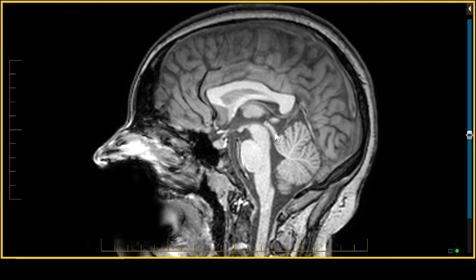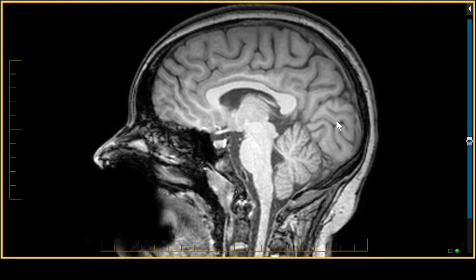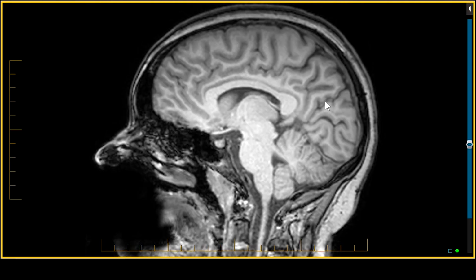We've got the collicular plate, the inferior colliculus, and the superior colliculus. Behind that is the cerebellum with the lobes of the vermis lying below the tentorium cerebelli, and there's the straight sinus and vein of Galen. Now just above that, if we scroll a little bit, we've got the occipital lobe, responsible for vision with the calcarine sulcus. Separating the occipital lobe from the rest of the brain, including the cuneus and the precuneus, is the parieto-occipital sulcus. So this is the boundary between the occipital lobe and the parietal lobe.